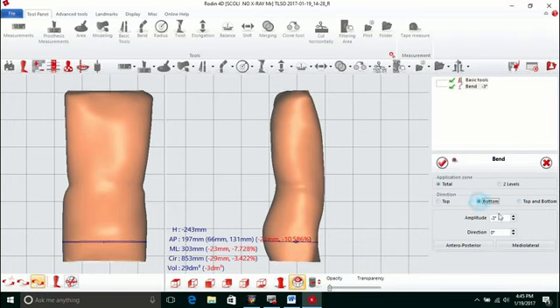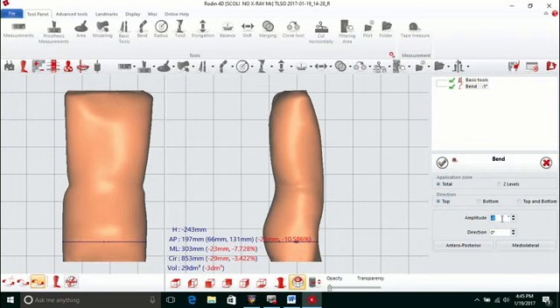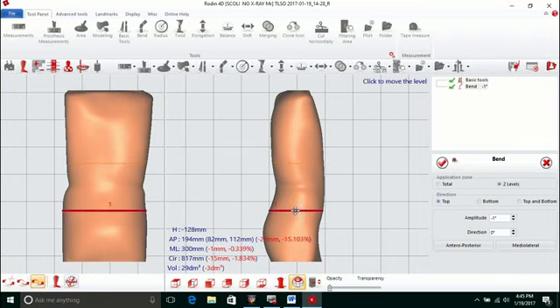You can also just control the bottom or top. If you select two levels, you can actually select which levels and where you want that on the model. So when you left click, it does drop these red lines. If I hover my cursor over it, that's a little hand. If I left click, hold down, you get your 4 arrows and you're able to maneuver these lines where you want them. So you can actually do the modification in real time.